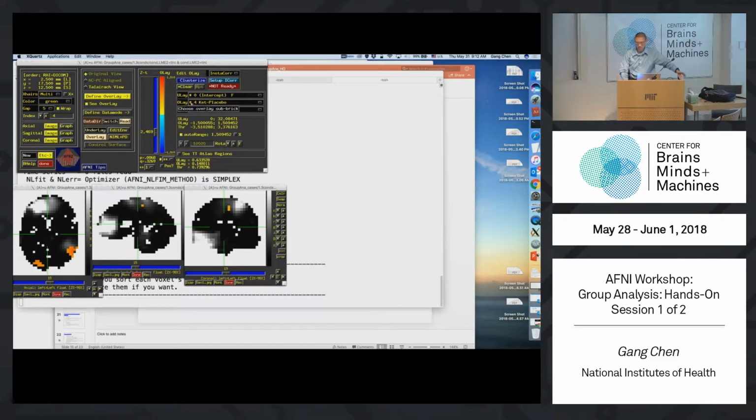Okay. So you can do the same thing for the negative 1. So you go there, then I change that to negative only. So now on the screen you see the blue ones. You don't see the orange clusters. So that's how you deal with switching different directions.